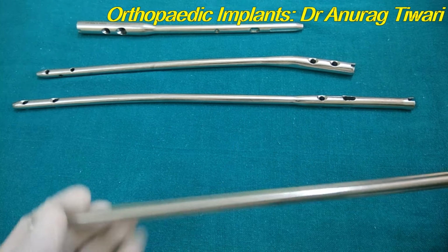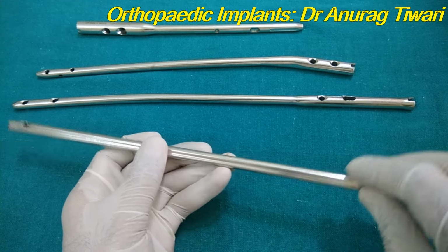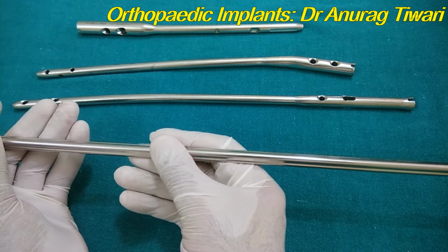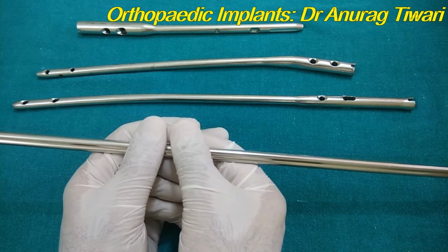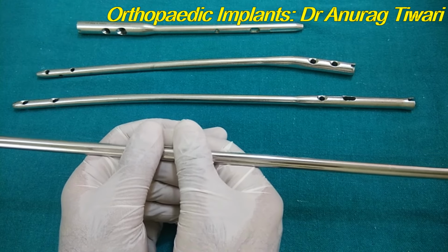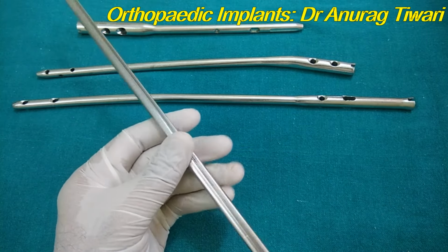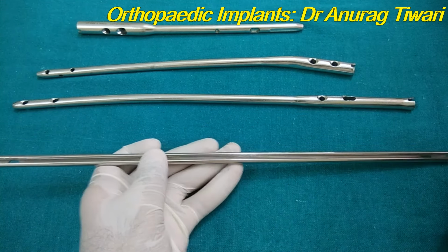Now the basic mechanism or the basic principle of the K nail is 3-point fixation. When we insert this in the femur, one at the lower end, and in the middle is the isthmus. So it provides fixation at 3 points, 2 at the ends and 1 at the isthmus. The isthmus is the narrowest portion of the medullary canal of the femur or any other bone. However, it does not provide any rotational stability. So it fails to provide the rotational stability, and that's why the interlocking nails came into the picture.